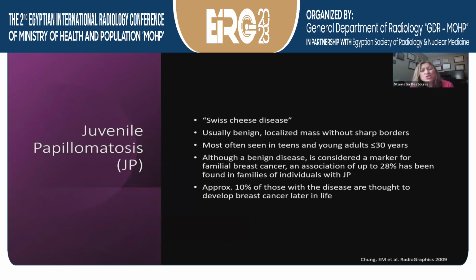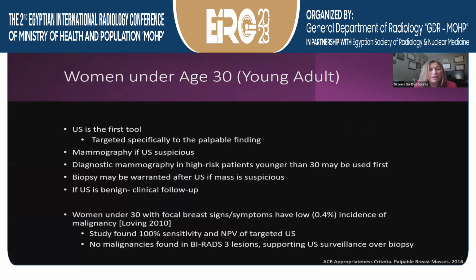This is called Swiss cheese disease. It's benign usually. It may be found in young women that are 30 or less, and there is an association with breast cancer over time, so we do still recommend that it comes out.